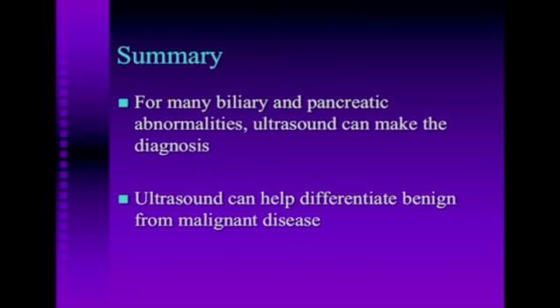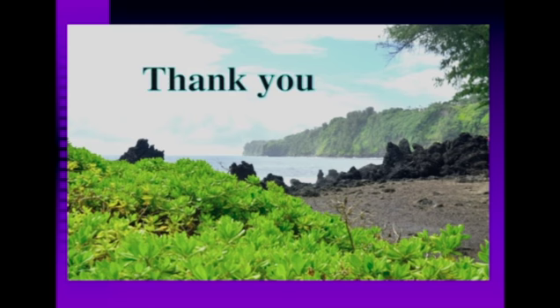Well, that's sort of a whirlwind tour through the biliary system and pancreatic abnormalities by ultrasound with a little bit of correlation. I hope to point out that for many biliary and pancreatic abnormalities, ultrasound can make the diagnosis, and then also ultrasound can help you differentiate benign from malignant disease. Thank you for your attention.